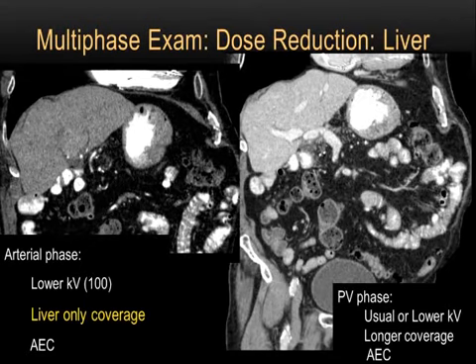And then again, we do not do any non-contrast imaging for our liver. We have eliminated non-contrast imaging, so it's never a 4-phase study. It's 3-phase, but the dose is actually only 2x. It's not 3x. Another thing to remember is that because you have higher contrast density or actively circulating contrast in the arterial phase, that's the phase where you want to target lower kV.